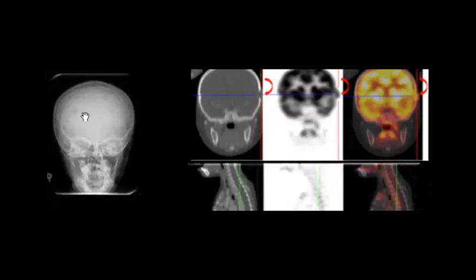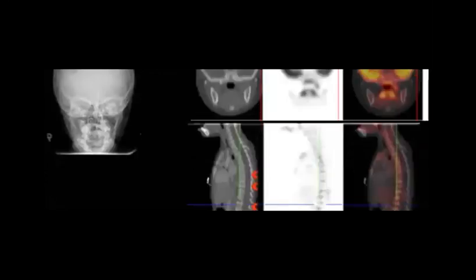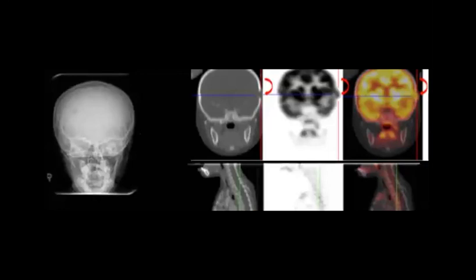So you find some lytic lesions in the skull, okay? So lytic lesion in the skull, what are you going to put as differential from the X-ray alone? Then if you go to the CT, again the lytic lesion, and he wants to show you something here. So our star mentioned the EG, Ala, Reem, Nermeen, yeah. So EG will be a good differential. Metastasis again will be a differential. But the EG, as you mentioned, with lytic appearance, will be a good differential, okay?